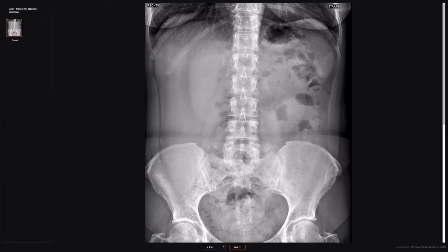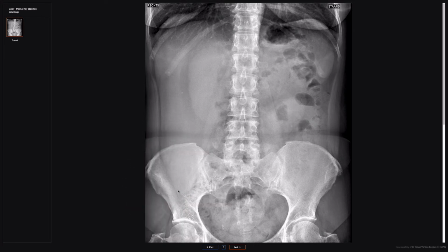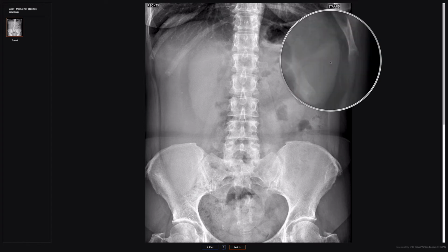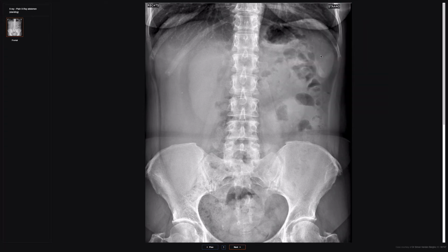Now, this is an example of a liver that's slightly enlarged. You've got the right lobe, which comes all the way down here to well below the iliac crest. So this is a Riedel's lobe, which is an anatomic variant of an enlarged right side of the right lobe of the liver. But this is a nice example where you also see normal kidneys, and then also in the left upper quadrant you see the normal spleen. Okay, because the soft tissue of the spleen itself is more dense than the surrounding lower density fatty tissues.